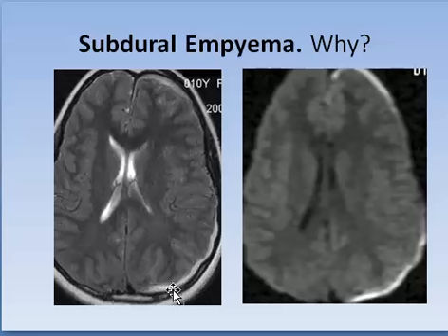Why is this empyema? Because there is restriction on diffusion. It behaves like an abscess. See this one. This is subdural empyema behaving as an abscess.